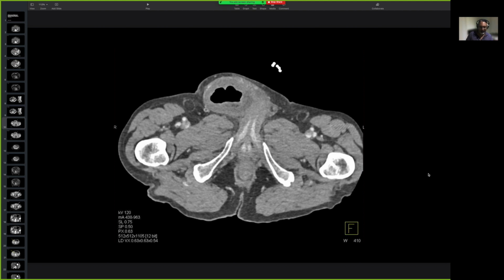Now what is this? This is low down in the pelvis, and this is a male, and the hernia seems to be going into the scrotum, and that is an indirect inguinal hernia. Oh, and it was labeled as a case with bowel obstruction. I think where I picked it up must have mentioned bowel obstruction, but here I can't tell if the bowel is obstructed because the bowel is higher up. If I had the full CT, I could have told that: when I went higher up into the abdomen, there'd be a bowel obstruction, and lower down you'd see the hernia.